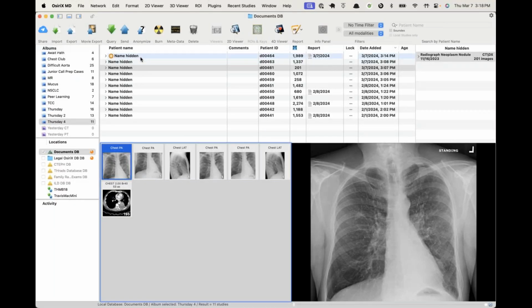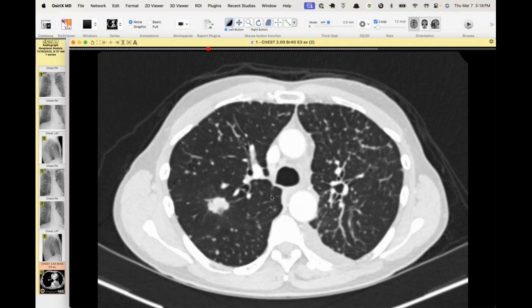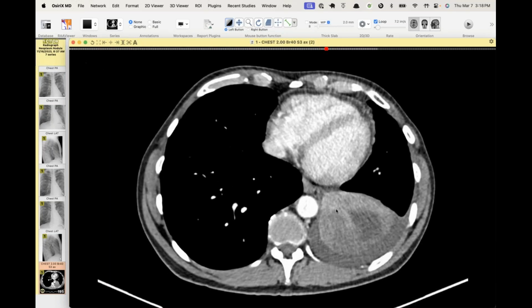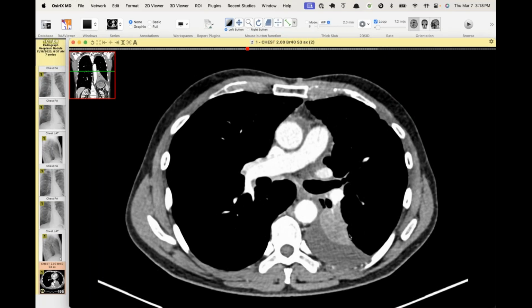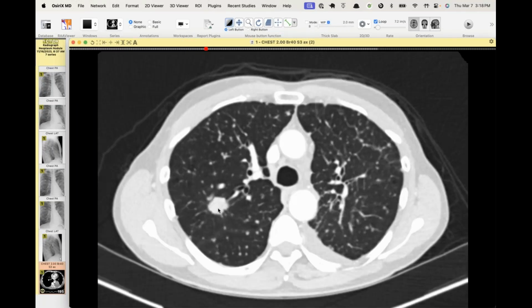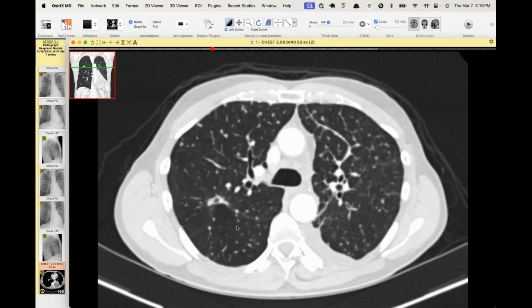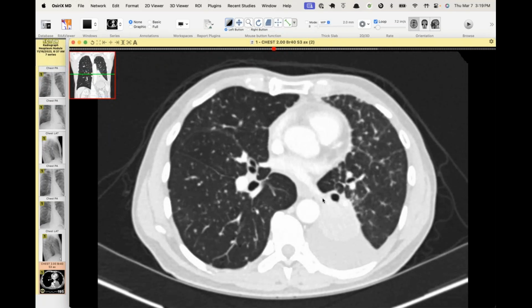So you think the left lower lobe was the primary site and the other nodules were metastatic, including that ragged looking one in the right mid lung? Yeah, that's a good question. Just given the fact that it was most of the left lower lobe basilar segments that are replaced with tumor here, I think it probably was. I didn't pull up any of the follow-up CTs where things decreased. Your guess is as good as mine, but I would bet that it probably was. And who knows, could this be a synchronous primary? Sure. But I didn't delve into it that much. I just thought this was a good radiograph.